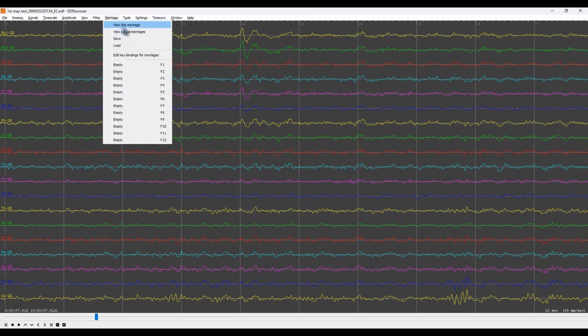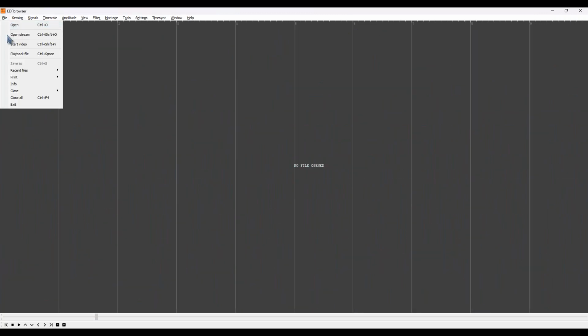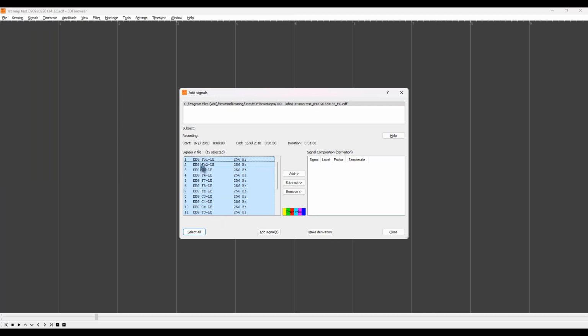And for those of you that aren't aware, Dr. Suter did a 2-part series specifically on artifact. Let's see if I can bring these up quick for you, just to show you where they're all at.